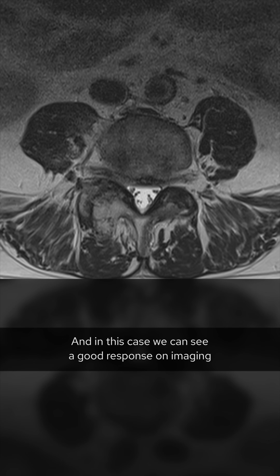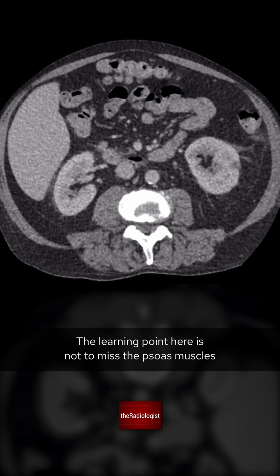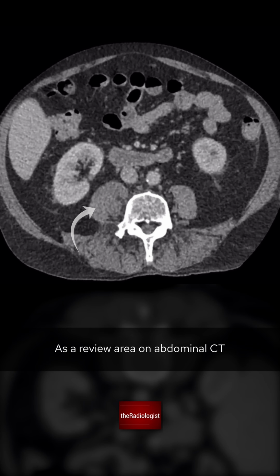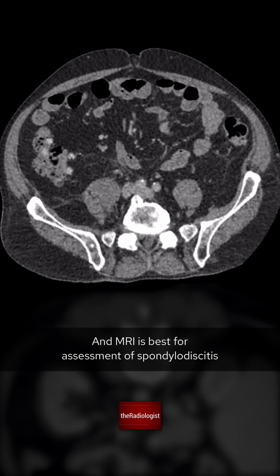Most commonly, discitis is initially treated with a long course of antibiotics, and in this case we can see a good response on imaging, with improvement in the right psoas abnormality at 2 months. The learning point here is not to miss the psoas muscles as a review area on abdominal CT, and MRI is best for assessment of spondylodiscitis.